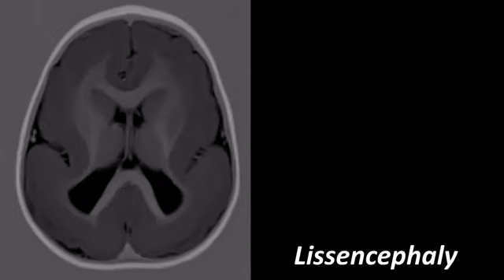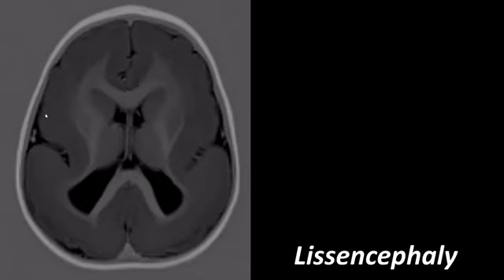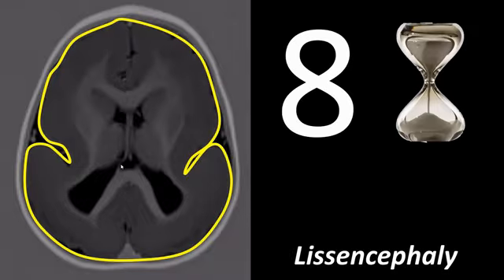Let's start with this, however. This is a patient with a genetic disorder called lissencephaly. And on this T1 weighted image, we see, first of all, that the brain looks extremely smooth. We see hardly any sulci or gyri in this brain. And if we look at the configuration, we can recognize a figure of 8 or an hourglass.